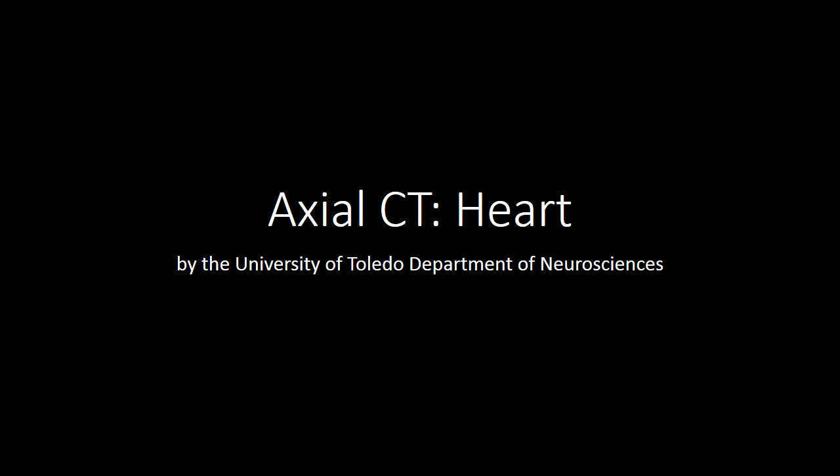In this video, we will be identifying major structures of the heart using an axial CT. We will be identifying major vessels such as the aorta and superior vena cava, as well as the chambers of the heart. We will not be discussing smaller structures such as the coronary arteries during this video, since this presentation is just to give you an overview of the major structures. Please consult your lecture materials on those structures, in addition to the plastinated hearts in the anatomy lab.